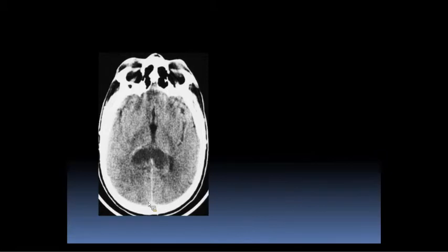Here, we'll just look at this case. This is without contrast, and we see a hypodense lesion here. So this is either a hypodense lesion or an area of edema. This is expanding the splenium of the corpus callosum. Based on this alone, it's hard to really tell what it is, but we would think of a mass involving the corpus callosum or an edematous process.